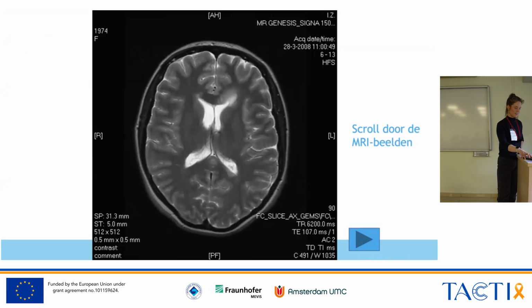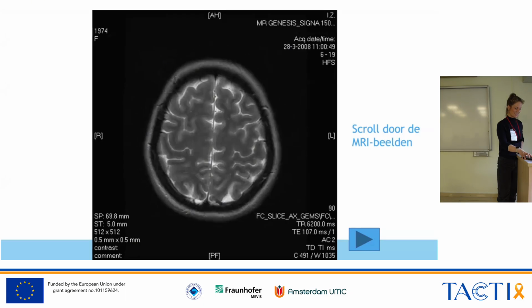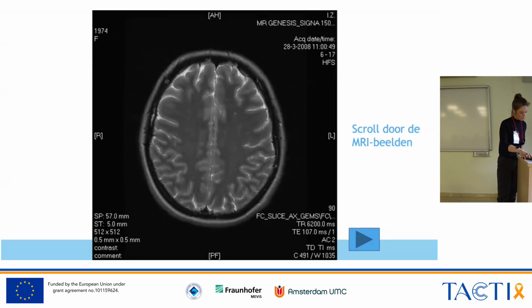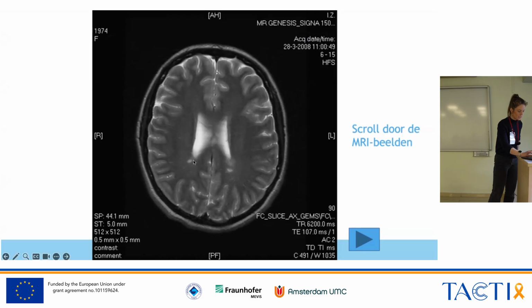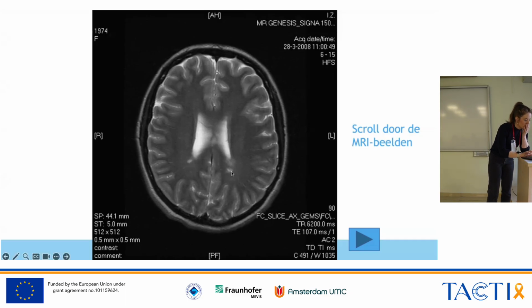Can you go back? This back? No. Other back? Yeah? Top of the head. Yeah, this one. No, I think this looks normal. This is a normal vascular space. But if you go down, I thought that was what you meant. This and this, yeah. And you could imagine a central vein sign if you see this clinical picture here. It's more difficult, more easy. You see some stripes if you look at the screen. So you could visualize a central vein sign here within the lesion in your head. So we have this one and we have this one.